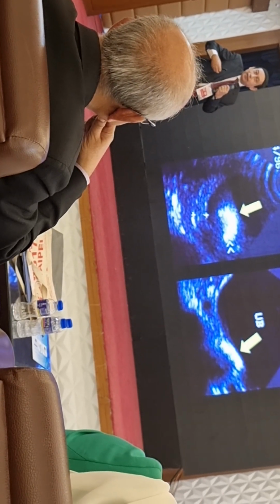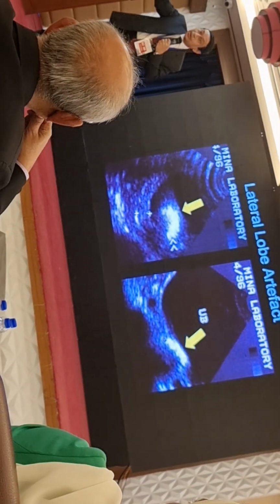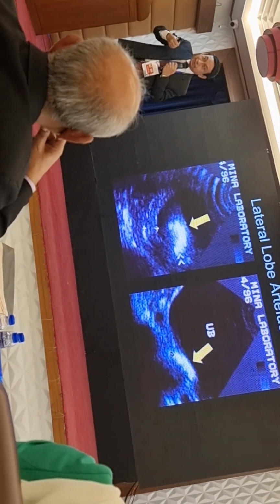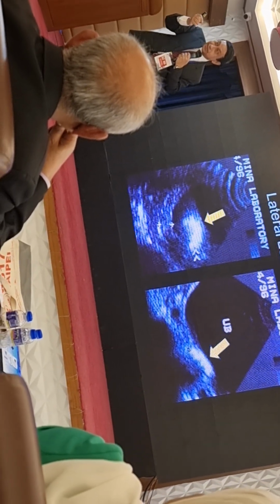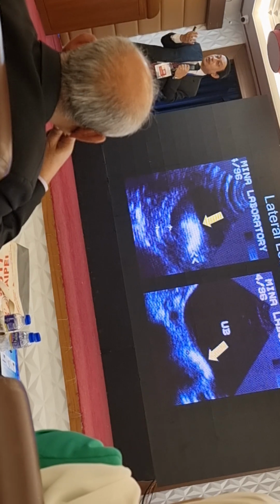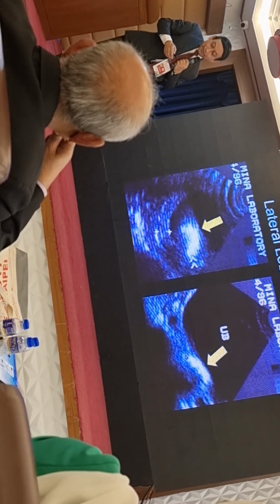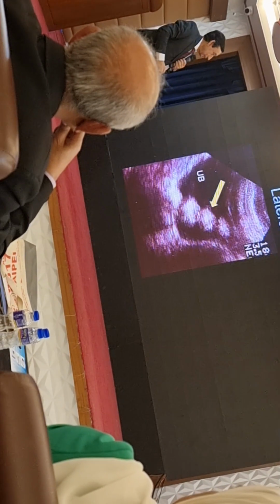Especially in gallstone. There are some echogenic spots outside the gallbladder. These artifacts pull them inside the gallbladder. So inside the gallbladder, there are some echogenic structures. What is the diagnosis? Gallstone. But after surgery, no stone. So this mistake is not so uncommon.